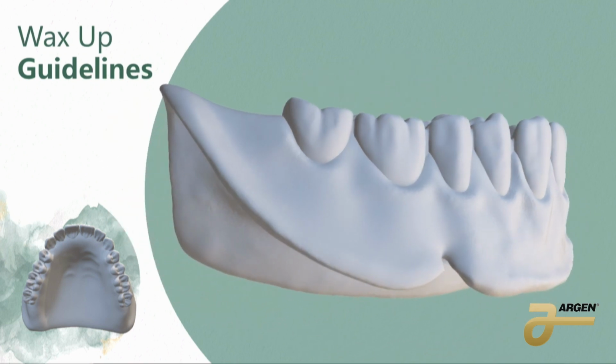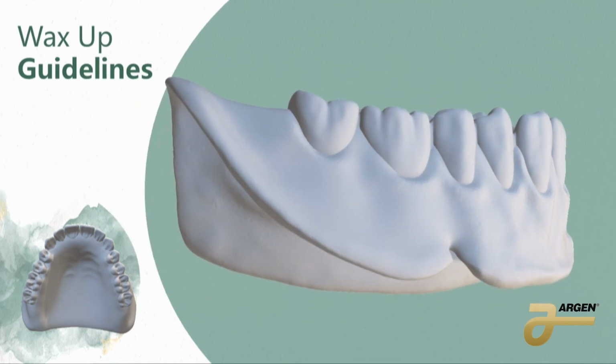If we look on the side here, similar things. On the upper, I didn't point it out, but like upper and lower, I typically do not characterize beyond the second premolar. I don't do festooning. Even the roll around the teeth is nice and smooth. That's where everything's going to build up, and we don't really see that area anyways when they're eating, functioning, right? So we can smooth and blend that area out. So it's going to be really easy to clean that spot.